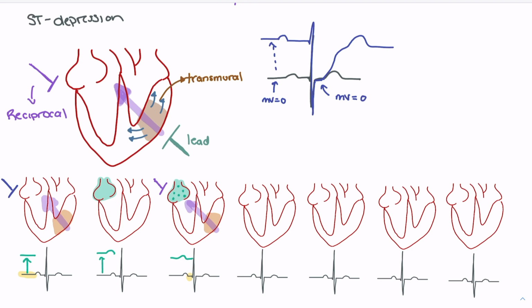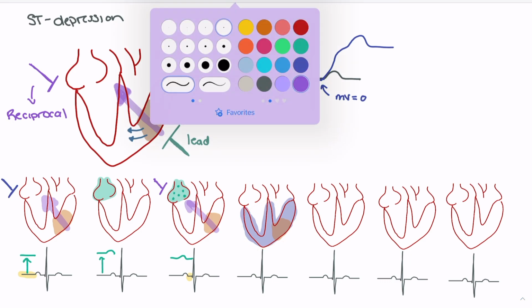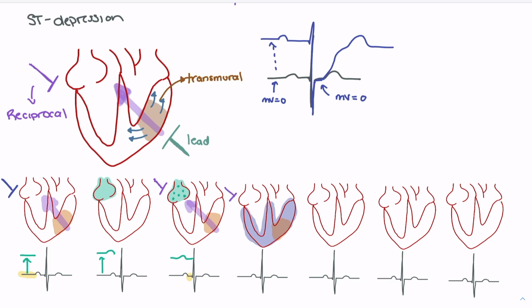What's going to come next is our ventricular contraction. So we'll see our QRS complex like we expect to see. We see depolarization of the ventricle, which results in our QRS complex. The atria is going to repolarize at this point, so we won't shade our atria in because it's repolarized, or in the process of repolarizing. And we have our injury here, but we can't really see it because we're watching that big ventricle depolarize. When you have this big massive tissue depolarizing, it's really tough to see anything else going on there. So as a result, we get a typical QRS complex.